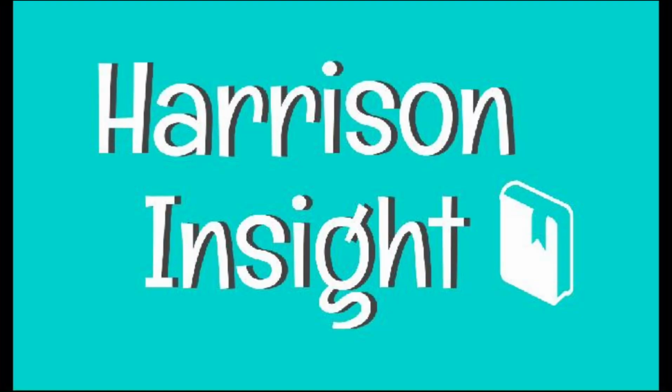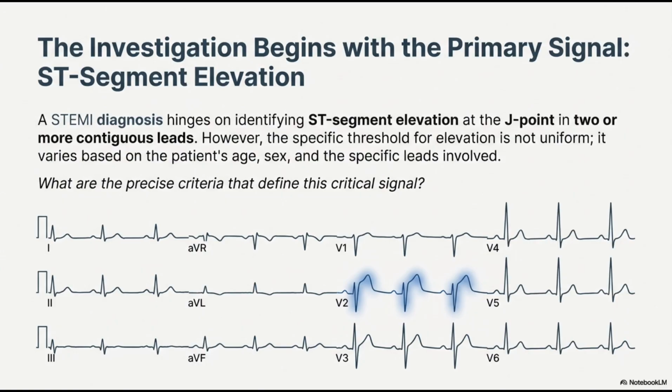When you look at an electrocardiogram, that classic strip of paper with all the squiggly lines, it can just seem like chaos. It really can. But in that high-stakes life or death moment, that strip of paper stops being a collection of squiggles. It becomes a map. A critical map. It's the heart's electrical signature, and if you know how to read that topography, it tells you exactly where the trouble is. And that's our challenge today.